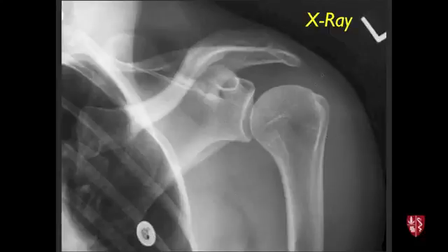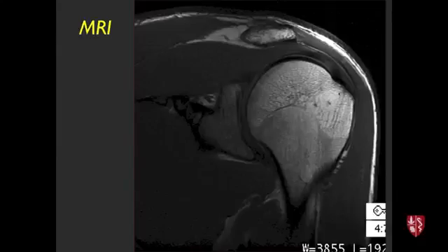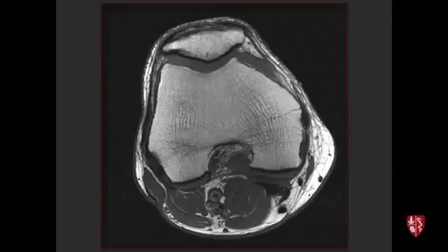But basically within this soft tissue compartment here, if you will, that's anything that's actually soft tissue, like a solid organ or a muscle or tendon, and fluid. Fluid's the same density, so you can't tell fluid from soft tissue on radiography. Whereas MRI, you see very distinct contrast between those tissues. So here's a shoulder again, here's the glenoid, here's the humeral head, here's muscle in here. So this would be the supraspinatus muscle coming out to tendon that you see as lower signal here, inserting on the bone.